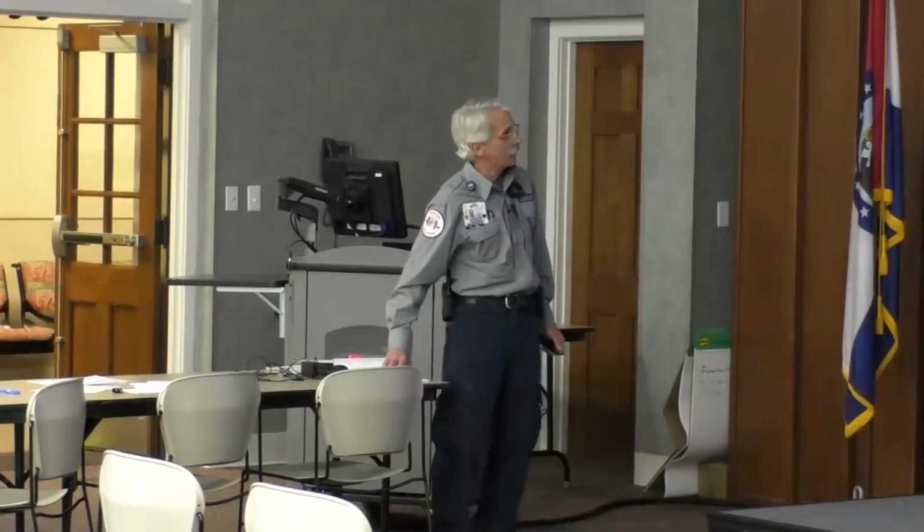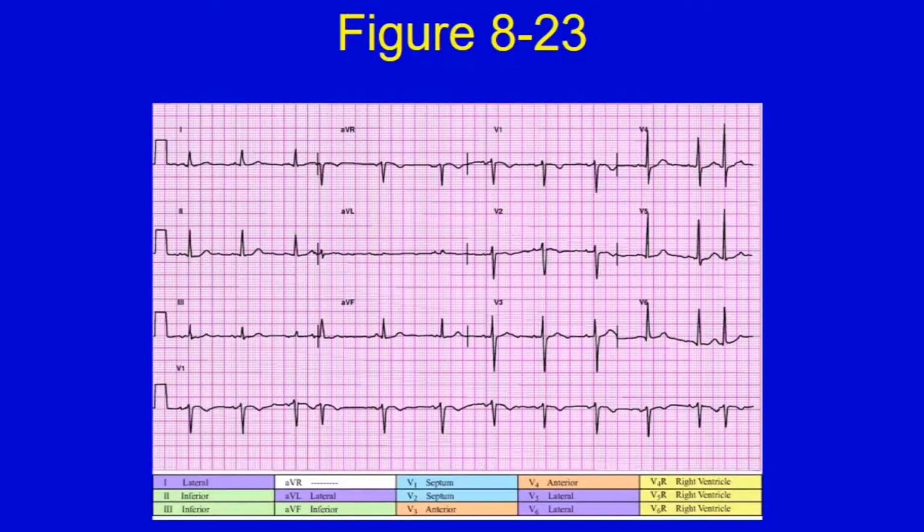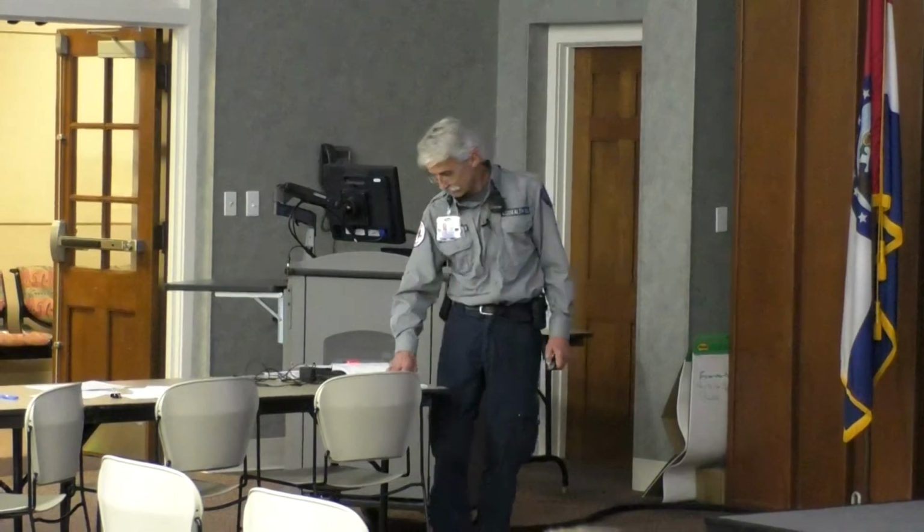You see a STEMI anywhere? That's primarily why we're here. I'm not going to spend a lot of time on this because we could break this down more and more and more. We're not going to. Is there a STEMI? I didn't see one, did you? Okay.